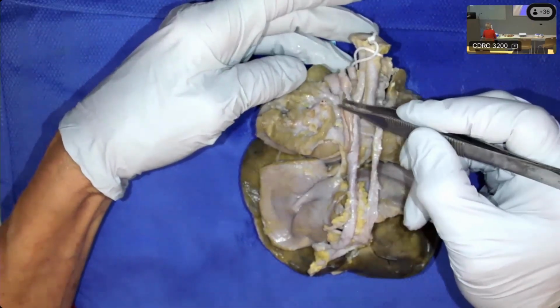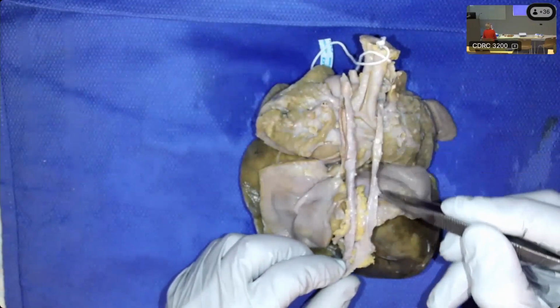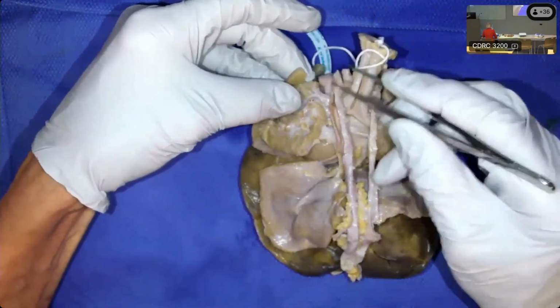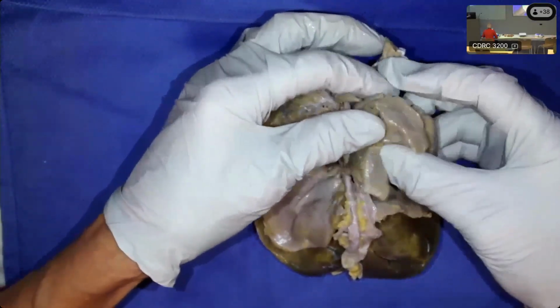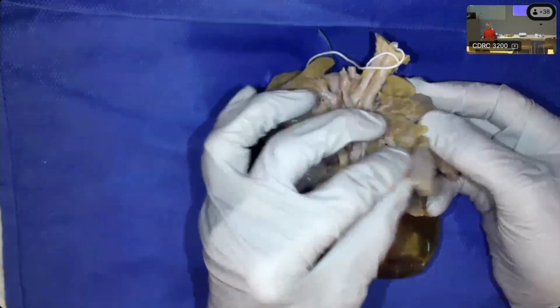And you can see here was a left aortic arch extending down the left side of the spine, and the azygous vein was along the right side of the spine. This patient had normal branching of the brachiocephalic arteries. There were bilateral, bilobed lungs.